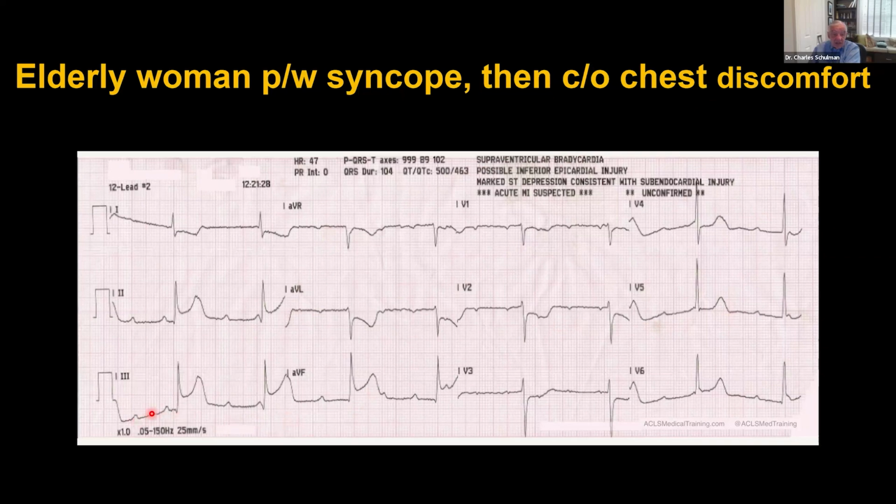Here are what look like sinus P waves, and what's the heart rate? 300, 150, it's about 140. So this is actually sinus tachycardia, right? Sinus tachycardia with what? With heart block, right? With complete heart block here. These P waves are kind of marching through with no relationship to the QRSs. Okay. What is the cause?